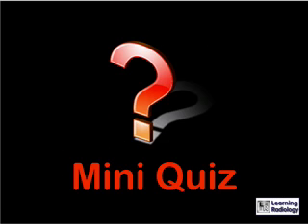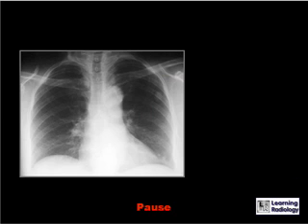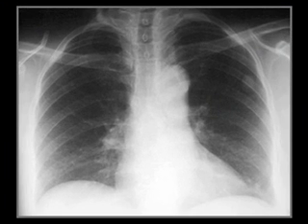So this is your turn. You could put your computer or iPod on pause and take a look at this chest X-ray and decide what the next study is the best to get.